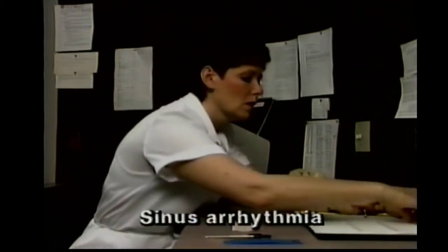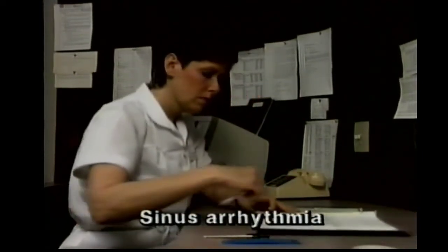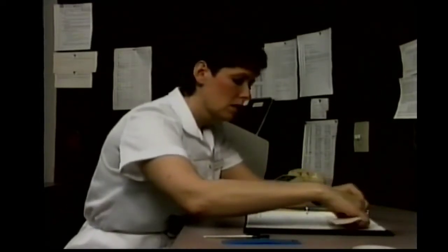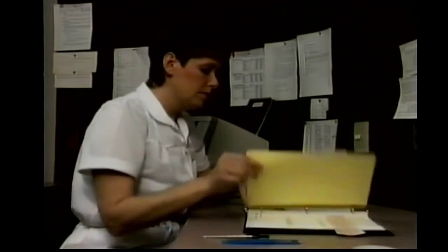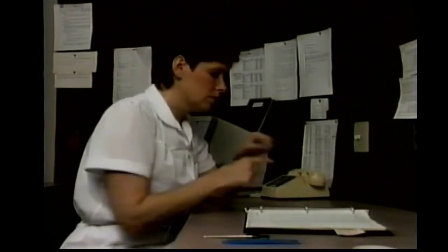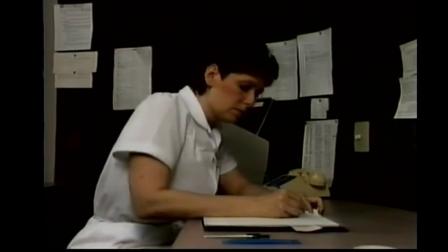The typical periodic heart rate changes in the rhythm is called a sinus arrhythmia, the most common type of cardiac dysrhythmia. It is a benign condition and does not indicate a change in the patient's condition. No treatment is necessary for this dysrhythmia.